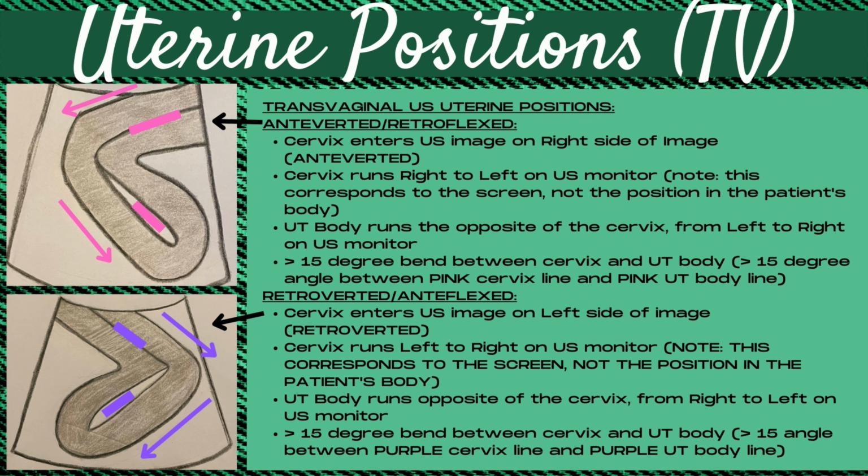And there's a greater than 15-degree bend between the cervix and the body of the uterus. And this is demonstrated by the purple line in the cervix and the purple line in the uterus body. There's a greater than 15-degree angle between these two purple lines.